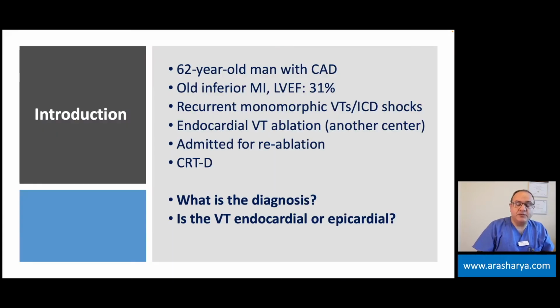Our patient today is a 62-year-old man, known case of coronary artery disease, old inferior wall myocardial infarction, ejection fraction of 31%, who was admitted to another hospital because of recurrent ventricular tachycardia and ICD shocks.